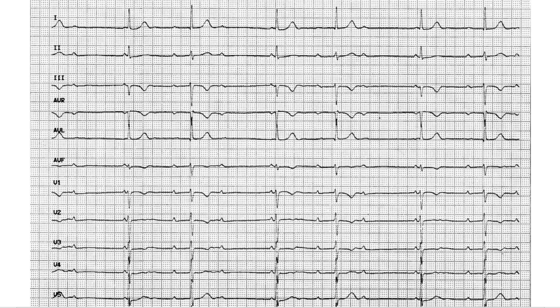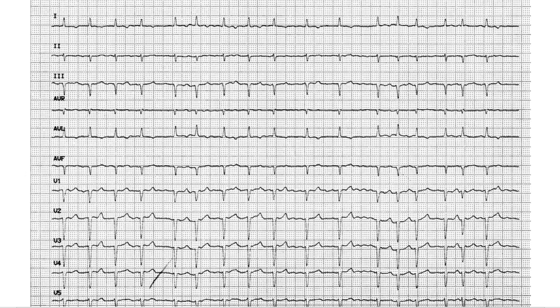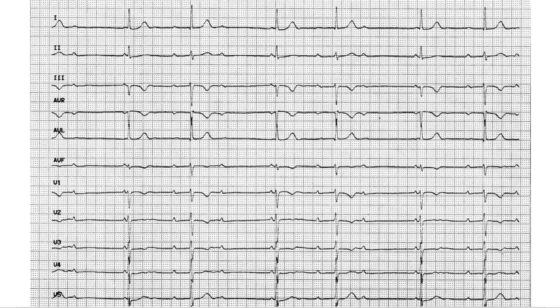Whereas in many examples of fibrillation, you can't really put your finger solidly on something being a P wave, because it's jiggling all over the place, like in V1. Another way to indicate this is the idea that here, which one was it? This was 37, right? Yeah. Here, the idea as well is that there's P wave, PQRST, PQRST, PQRST.